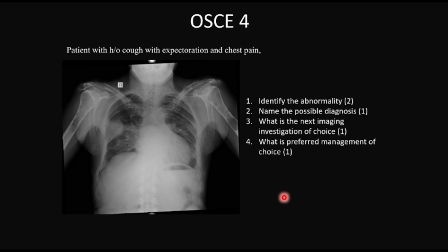First question is identify the abnormality. Second is name the possible diagnosis. What is the next imaging investigation of choice? What is the preferred management of choice?